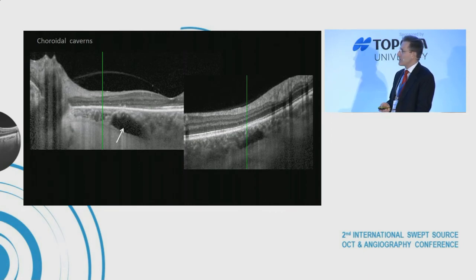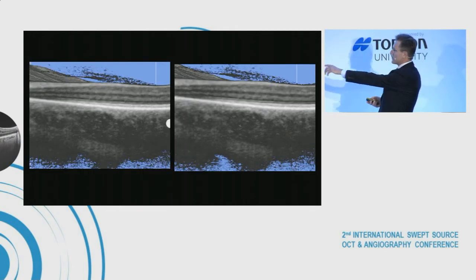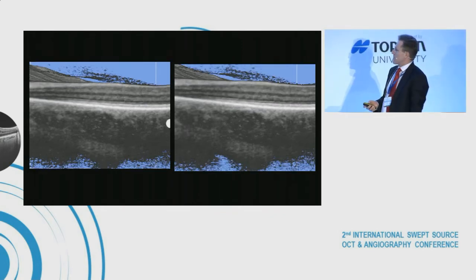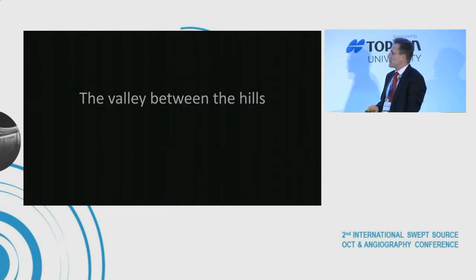Here is one of the new items that have been described by Professor Kvarkus and colleagues, choroidal caverns. You can have optically empty cavities in the choroid, and here I have tried to show that in stereo and in pseudo-stereo by just moving around. You can see that here we have a cavity. It comes out better on a laptop, but when you go home and try this, you will find similar items, and you will appreciate the three-dimensional nature of these renditions.